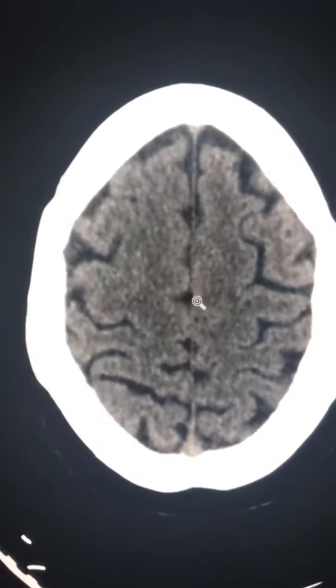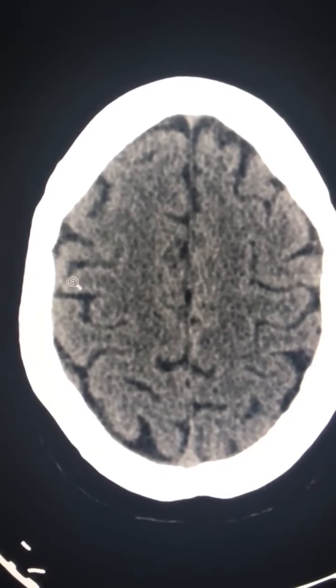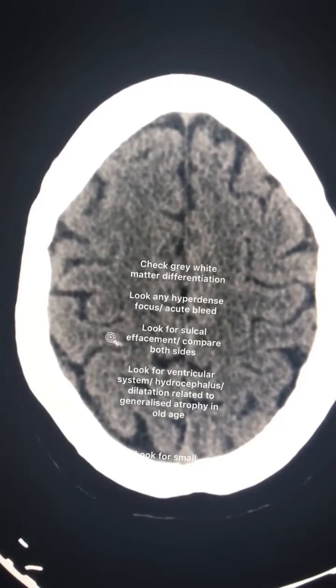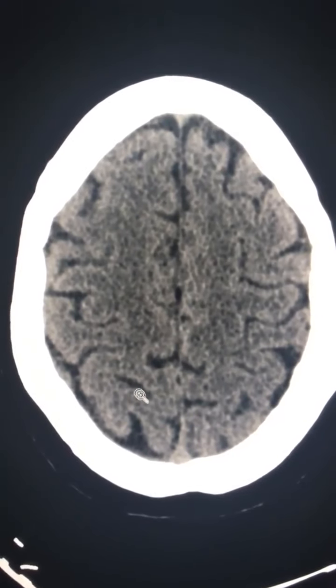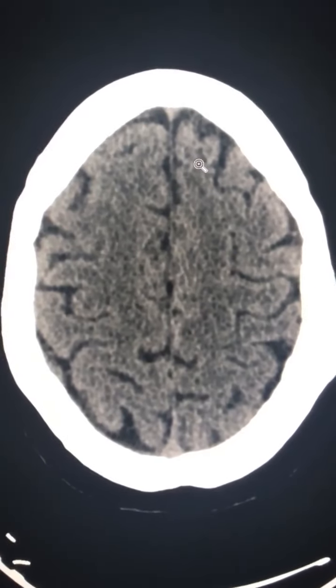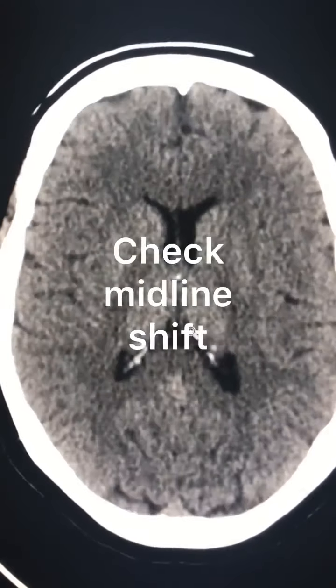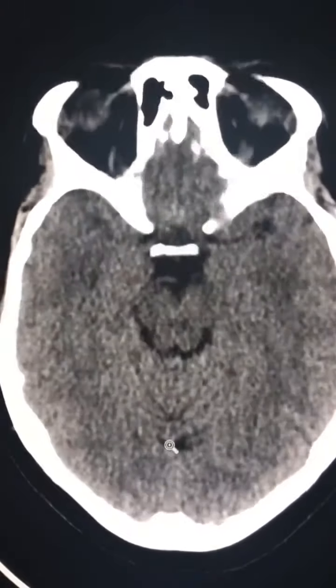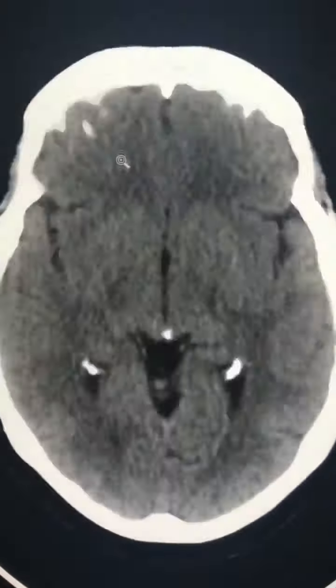Go down slowly, look for gray white matter differentiation, how nicely the gray matter is running around the sulci and the white matter is inside. Look for the differentiation, it should not be lost anywhere. Look at the right cerebral hemisphere, come down, keep looking at the temporal lobe here and finish it. Now go back at the top again.